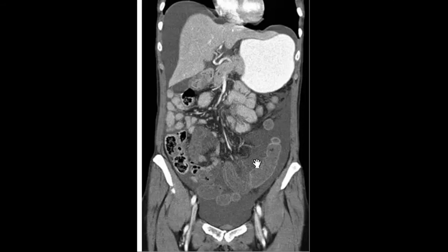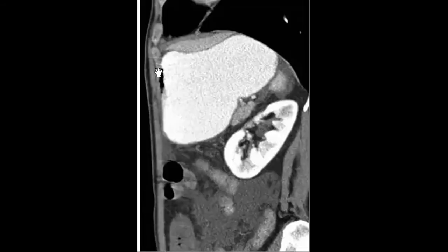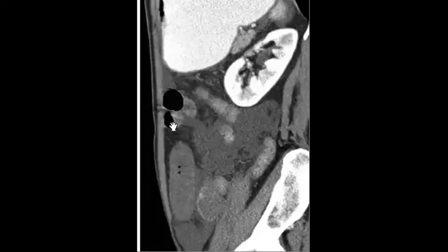As I think Ala mentioned that this could be, but no, it's not. First of all, this is the stomach, and even if it is this one, it is not in the wall, it is in the lumen. Okay? I know that I spend much time talking about this case, but it's important because in every exam you will find one case like this. Okay.